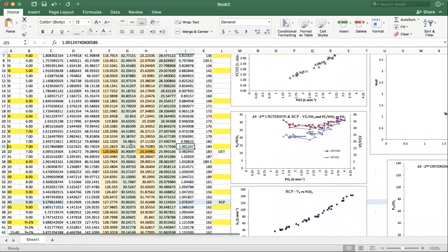So let's see 33, 35, 35, 31, 33, 33, 33, 32. 25, 29, 28, 27, 28, 29, 29. So probably closer to this data point, right around here, we can see that those variables are, relatively speaking, staying within about 1 of each other. So that can, in part, confirm that secondary criteria.